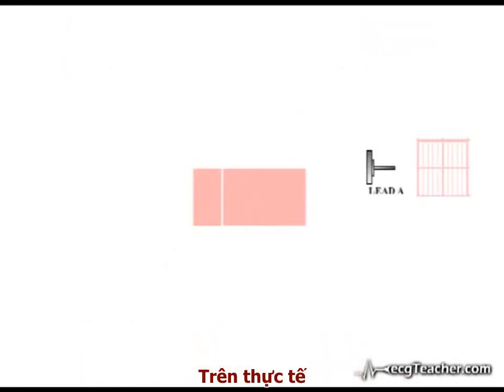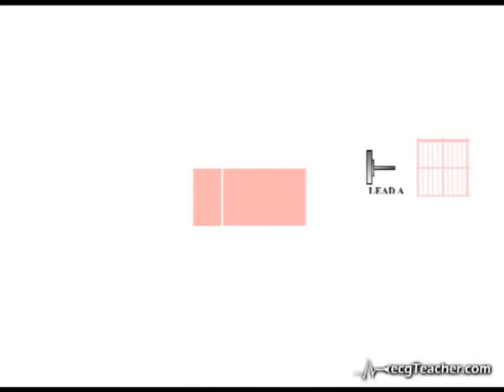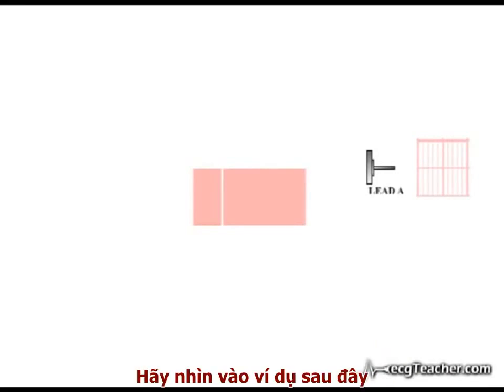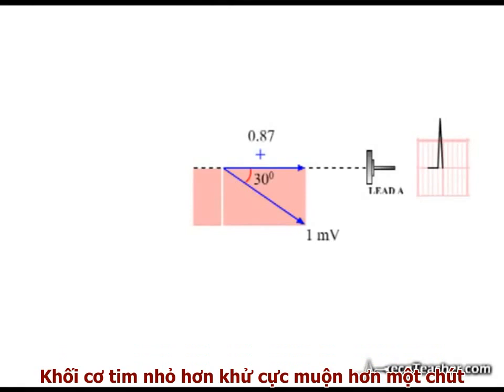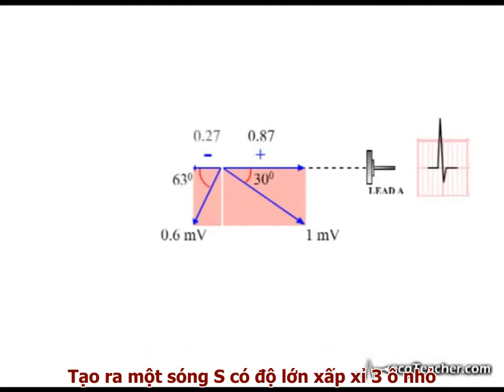In reality, of course, depolarization events are not all occurring at precisely the same time in different regions of the ventricles. It will help you later if we consider this in our simple model. Look at this situation. The larger section depolarizes first, producing an R wave of just under 9 small squares in the readout from lead A. The second smaller section depolarizes shortly afterwards, producing an S-wave of approximately 3 small squares.